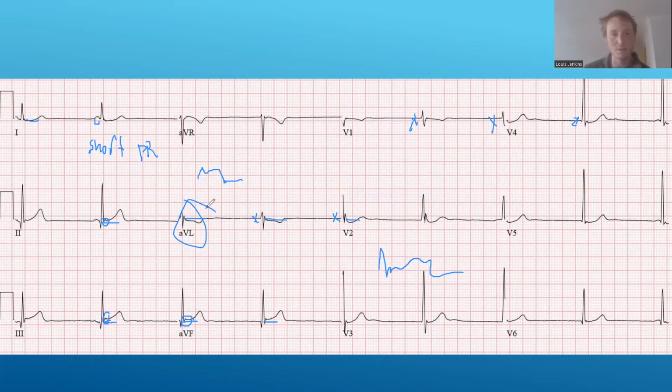But remember that if we look at aVL and we see that T-wave inversion and that ST depression, then this is not BER. This is a patient having an inferior occlusion, probably in the quite early phases of doing so. We can also see that there's some Q waves developing here, but they're not massive Q waves. So this is likely to be a more acute infarction. We see that patients who have had longer infarctions tend to develop more prominent Q waves. So that's sort of what I mean by that.